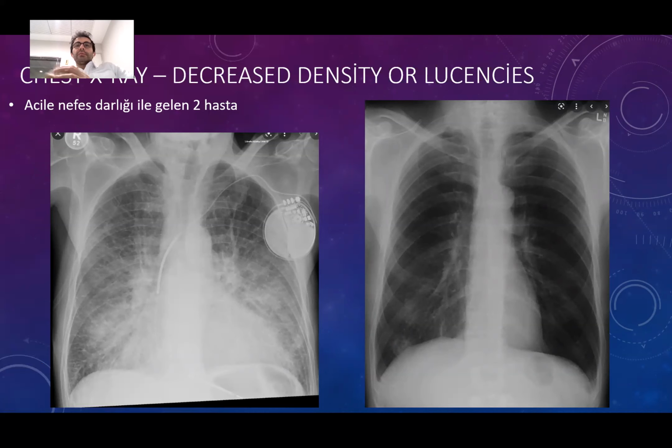So let's look at this image. We are seeing two patients who were admitted to the emergency department with shortness of breath. They are simply having trouble breathing. These are two different patients with the same symptom, but with totally different appearance, right? Let me go over these patients by myself this time. For the patient on the left, I'm seeing an enlarged heart, right? The heart is pretty much enlarged. I realize it right away.